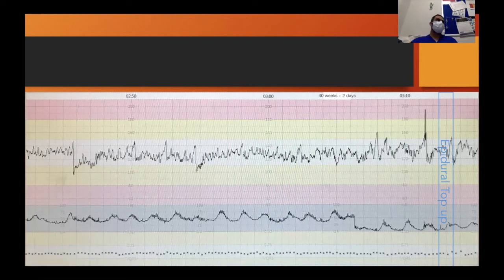But again, we don't get bothered by cord compressions. So if anything's happening with this lady, we may need to reduce the contractions. Okay. So far, baby seems completely unbothered by this. So much so that we can think about, okay, shall we just carry on?